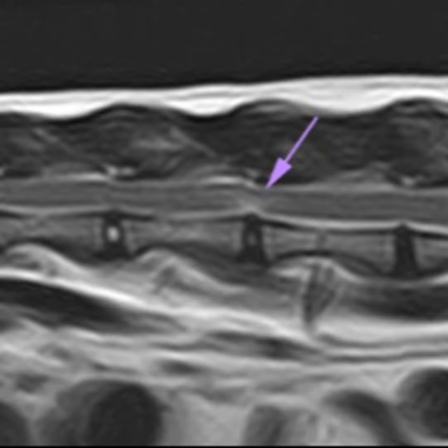We found a total of 50 intervertebral disc herniations, with a distribution along the spine of cats, as you can see from this table from the paper. And we divided cats by number, with a single lesion group composed of 39 cats, and 4 cats had multiple lesions. 2 of them with multiple lesions presented an intervertebral disc herniation that was outside the segments of the neurolocalization.